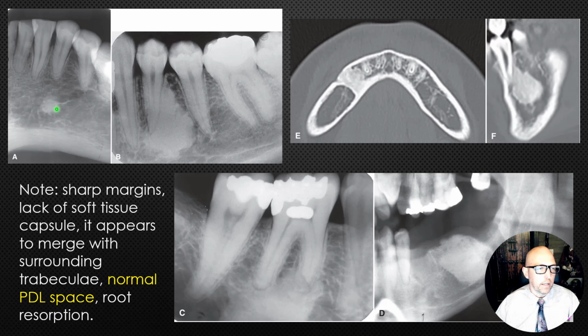There's an example down here in the anterior mandible, I guess right below the premolar. Here's what I was talking about with a periapical lesion. You never see where the PDL space is completely uniform like this. And so I don't see really much evidence at all that there's a periapical inflammatory lesion. So this one I'm not really suspecting is a condensing osteitis. You look at the tooth, there's no caries, no obvious fracture. If there's no symptoms, you do want to vitality test a tooth like this and rule out condensing osteitis. But just on that appearance, I strongly suspect it's just a dense bone island, just idiopathic osteosclerosis.